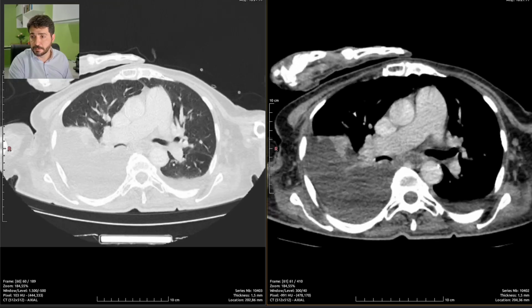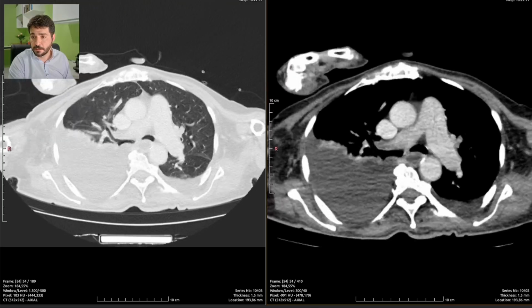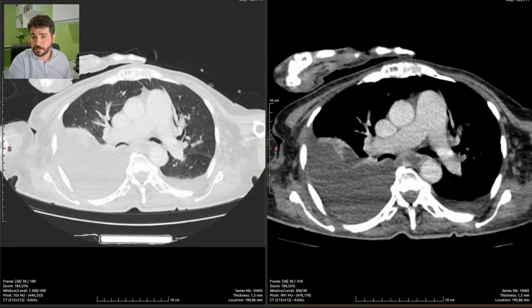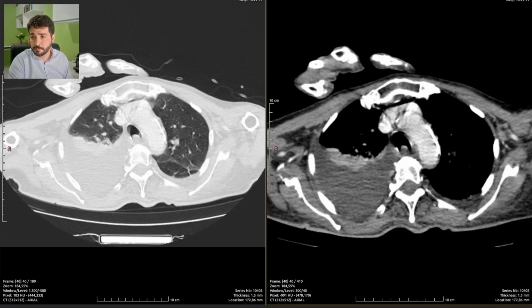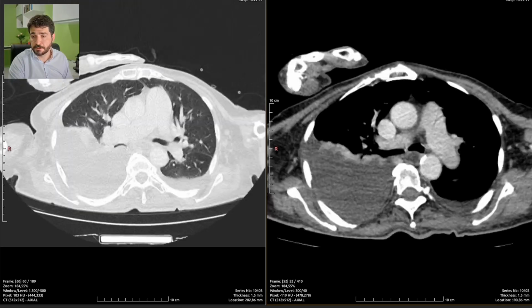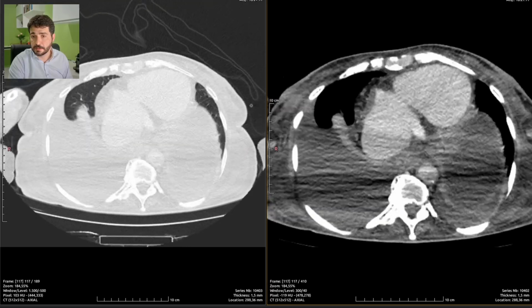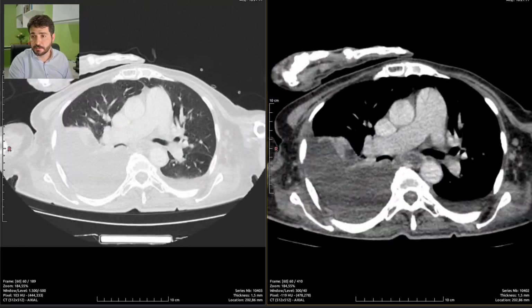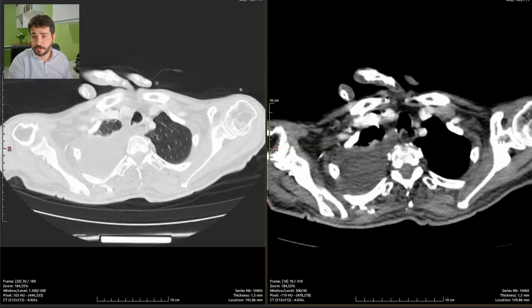I read from outside to inside, and there are some enlarged lymph nodes, not much on the axillary regions, and breast tissue seems as symmetrical as it could be, and is also all edema.